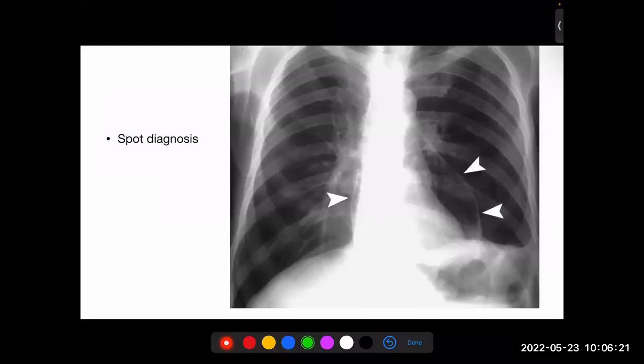What's happening? Let's start. Pericarditis. Why are you saying pericarditis? Okay, let's go through this. To be honest, I don't see the trachea, just up here a little, but I don't see it. What I can see is the lung on this side.